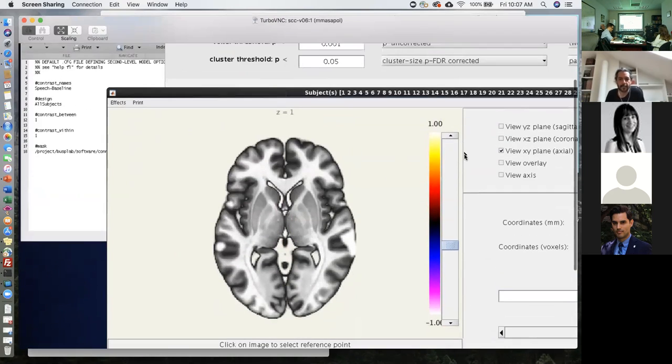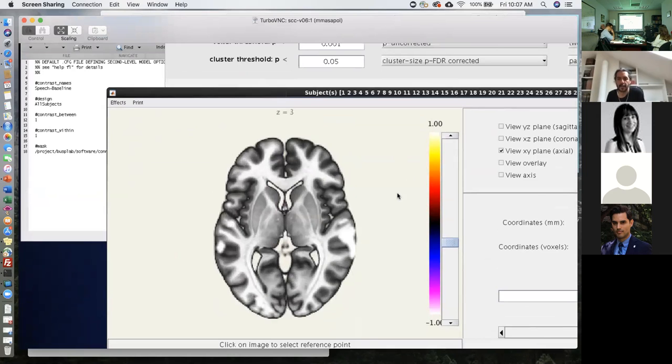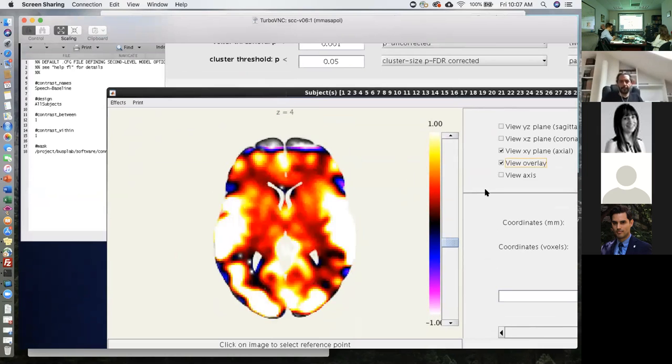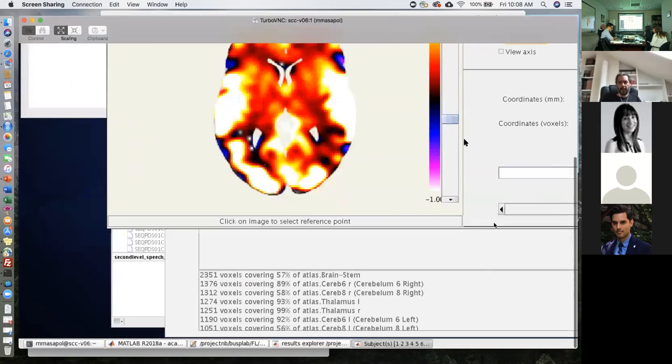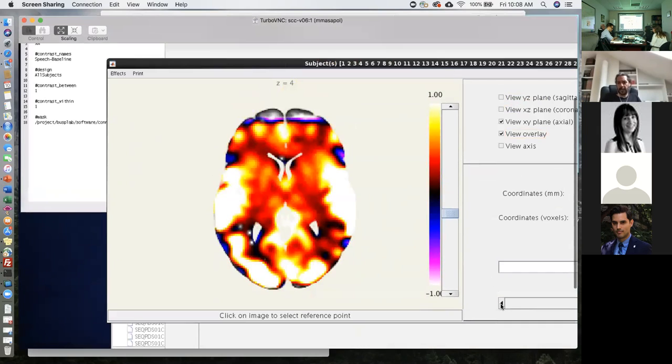A little bit more. Okay, so right here, when we put the overlay on, will we expect to see some? Here, just stop it there. A few overlay. We're expecting that. Right, and now move across subjects, and you should see that the actual position of those ventricles is different.